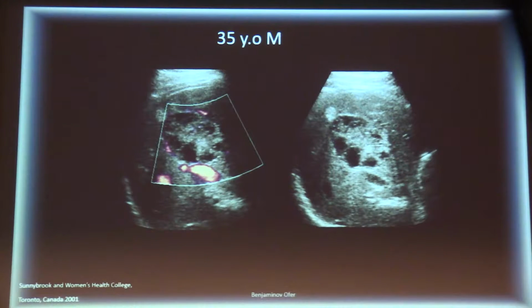Now, plexiform neurofibromas are very rare in the gastrointestinal tract and even more rare in the liver, but they can be seen in the liver because they track along the nerve fibers going along the portal veins and into the porta hepatis. So you usually will see them around segment 4 or segment 8 of the liver, but they are very, very rare. Now, if we had not biopsied this and not known that this patient has neurofibromatosis 1, we could have thought that this may be a category 3B Hydatid cyst.